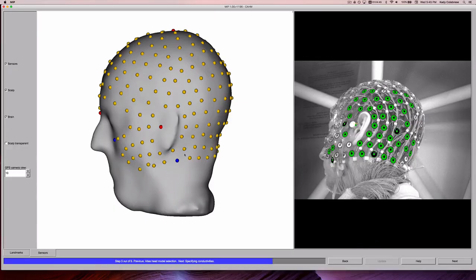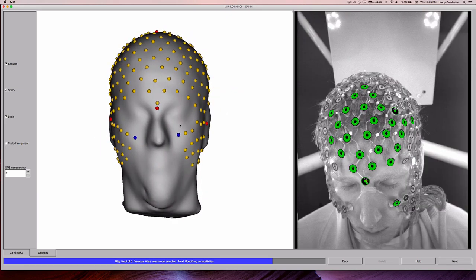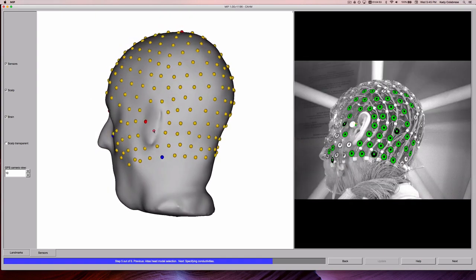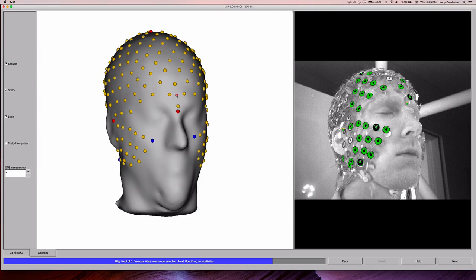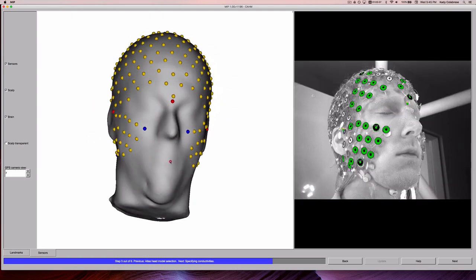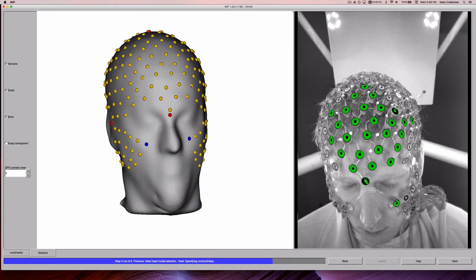Repeat the steps for evaluating the sensor placement on the atlas model. Review the facial electrodes, the electrodes around the ear. You can see the sensors along the brow ridge have been moved higher up. It is common to make several adjustments throughout this process.